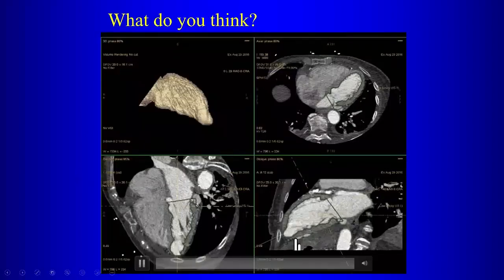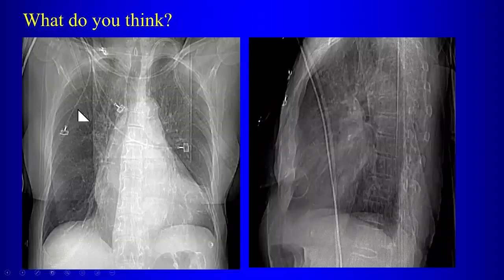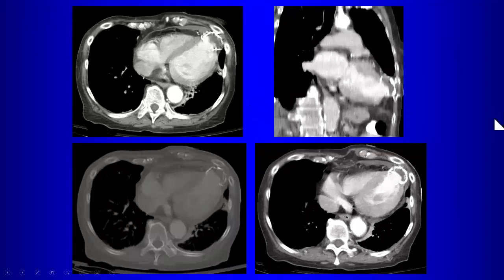Anyway, this is showing an aneurysm, a true aneurysm here in the apex of the left ventricle. Okay, and this is usually a sequela of an infarct, usually a sequela of an LAD infarct. And another manifestation of that on the plain film, with these true aneurysms, is they can go on to calcify. So we can get calcification there also where you have a true aneurysm.